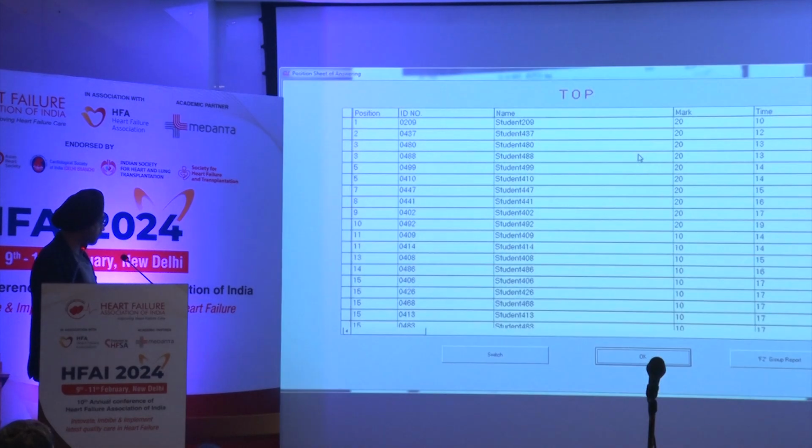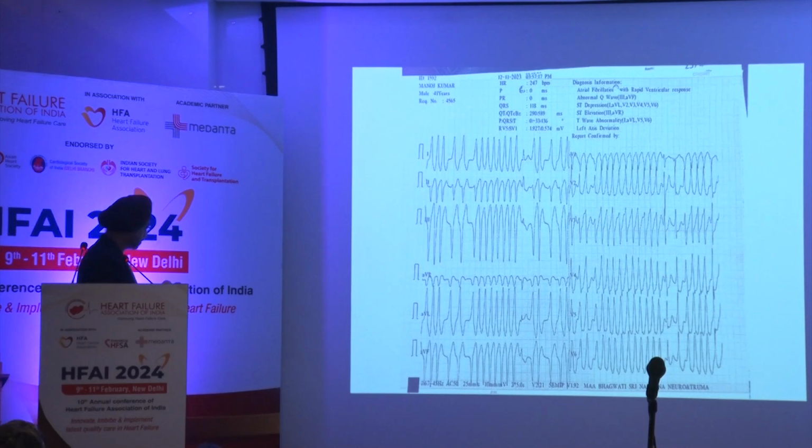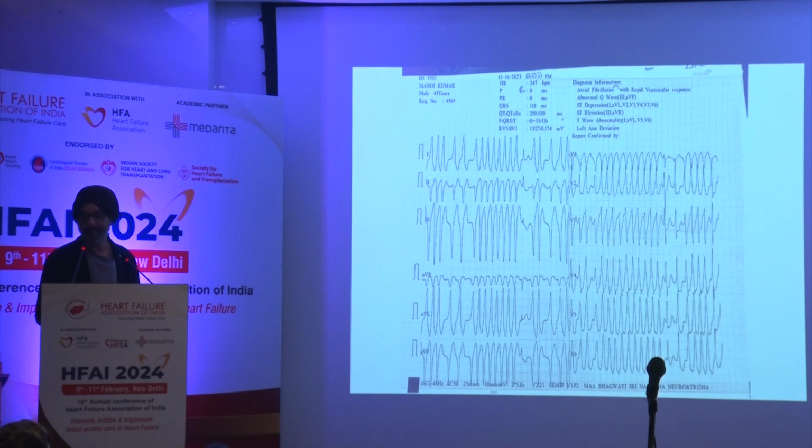So, first striking thing is, what is this? The first thing that strikes you is that this is an irregular arrhythmia. Clear? Any doubts on regular or irregular? So clearly irregular. Second, when this rhythm becomes very fast, if you look at the RR interval of 2 beats, the rate is around 300. Agreed? So it is a very fast, irregular tachycardia.